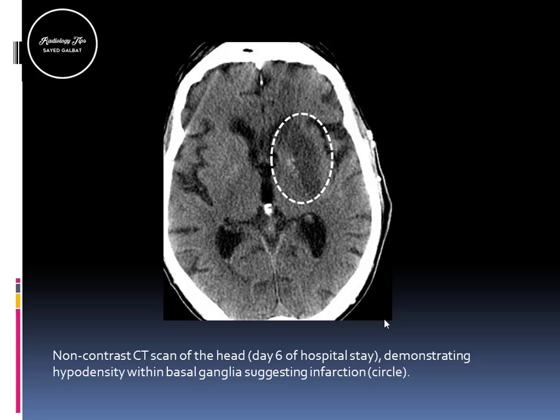So this case presented with an infarction in the left basal ganglia with a hypodense area here, seen obviously in the acute stage. Okay, so the hypodensity, again, I said, is due to the water content of this tissue because it's increased. With time, the body tries to remove this edema and this water, and some macrophages will come and fill this area just to clean the dead tissue.